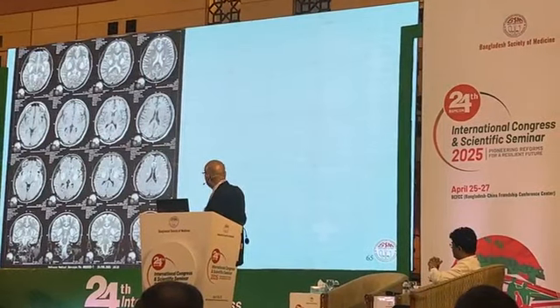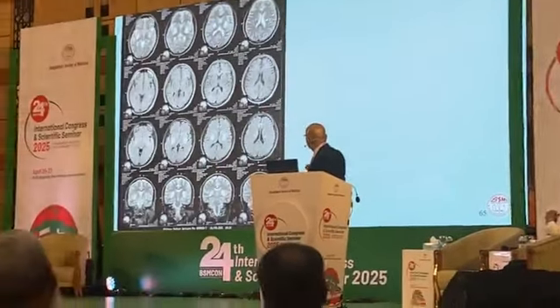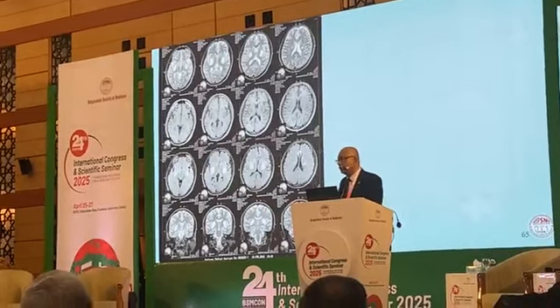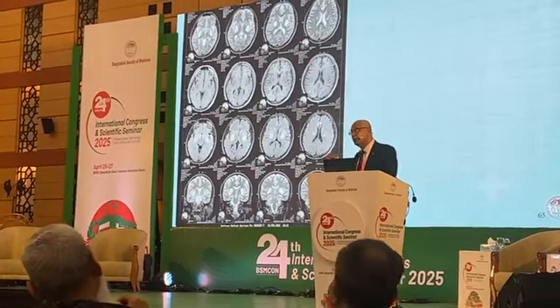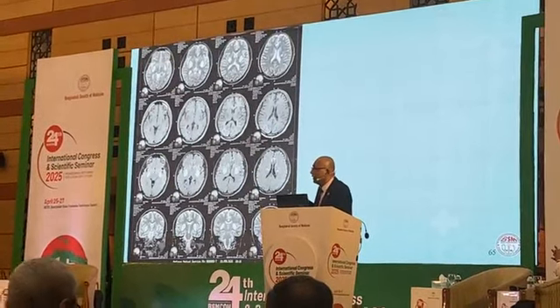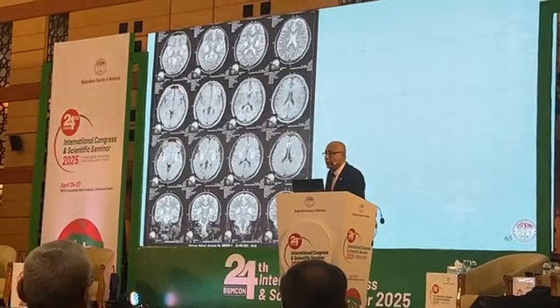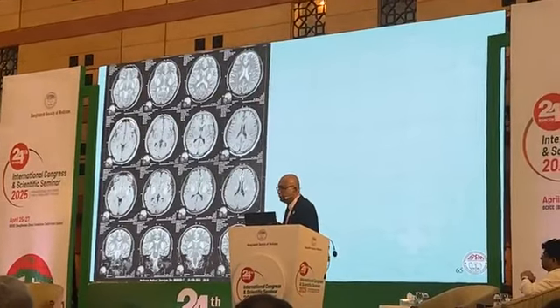This is bilateral basal ganglia lesions, symmetrical. T2 and FLAIR hyperintense. In this situation, we consider extrapontine myelinolysis in osmotic demyelination syndrome. So EPM in ODS, possible. But other causes are also possible, like encephalitis, hypoxic ischemic encephalopathy, and toxic encephalopathies, which can cause bilateral basal ganglia lesions.